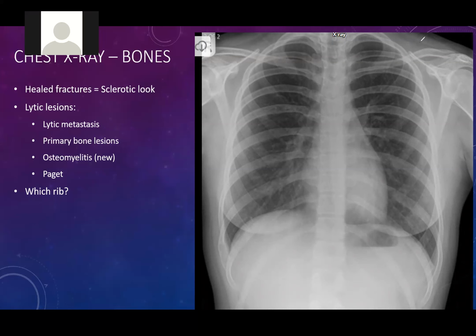In the clavicle, I think. Or in the clavicle, let me check the clavicles. I'm not seeing anything. Okay. On the left side. It's here. It's a lytic lesion with expansion of the cortex. Okay.